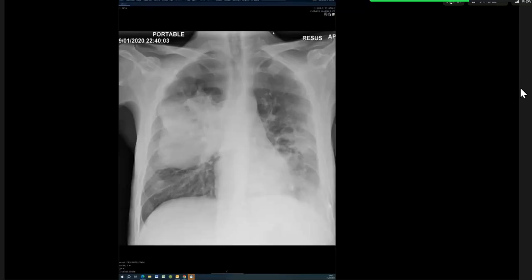The other one is seen in the left lung field in the lower zone and more peripheral distribution. We cannot detect any gas in the lower recess, no pneumothorax. So I am dealing here with a case of bilateral lung opacities.